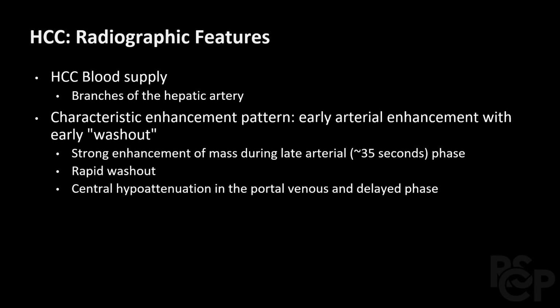Recall from earlier in our presentation that liver tumors receive a disproportionately greater amount of blood from branches of the hepatic artery. Therefore, hepatocellular carcinomas have a characteristic enhancement pattern, which includes early arterial enhancement with early washout.